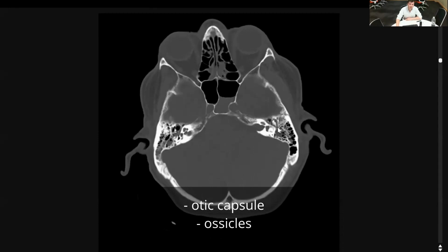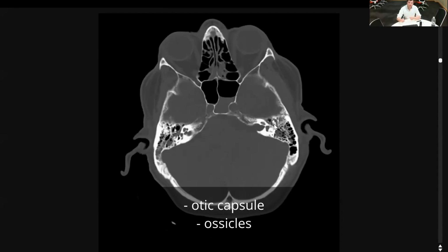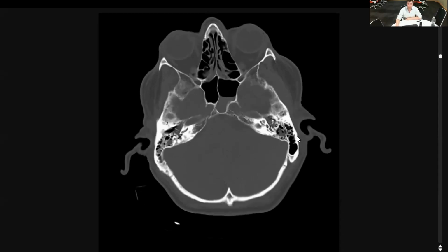And it's the same thing as well with the middle ear bones, with the ossicles. You can just say if there's obvious disruption, if they're ripped apart, that's a bad sign. But you can sort of caveat it. It depends if you've got good bone recons on your CT heads, which at the Royal we do at St. John's. You can sometimes ask for them to be reformatted.